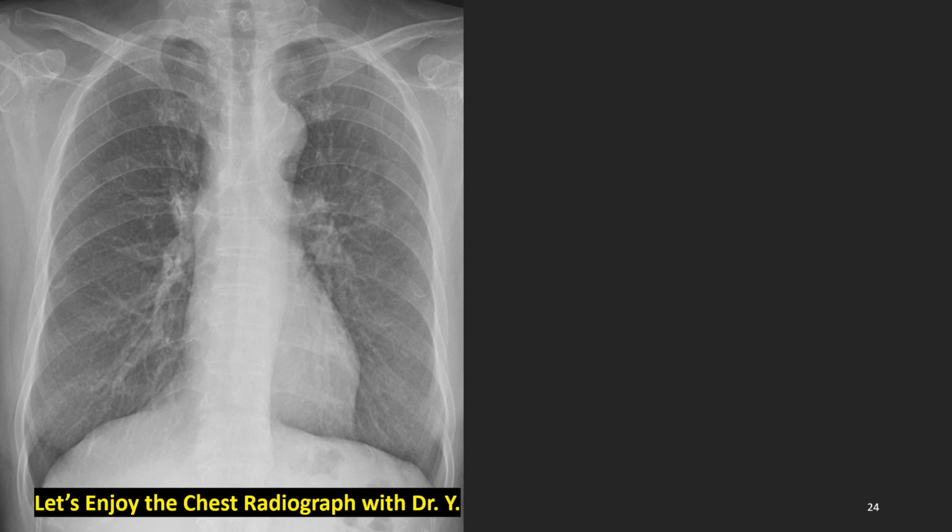Let's enjoy another patient image. What is wrong with this patient? Please pay attention to the highlighted area. You may not, and also I may not, find something. Yes, normal, almost normal looking. Let's go further.